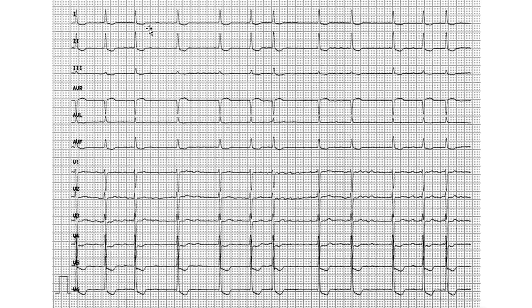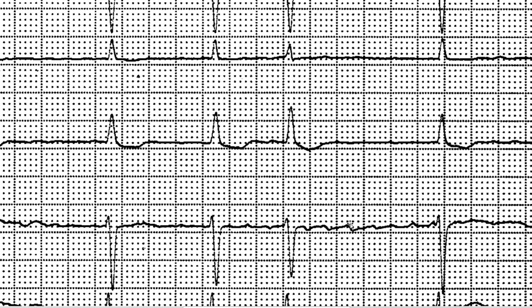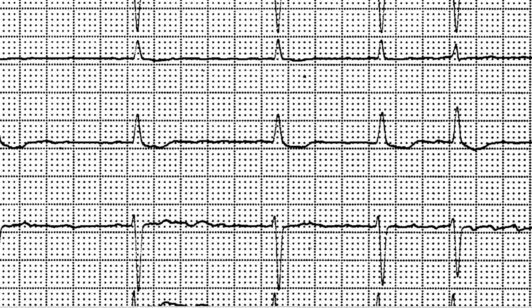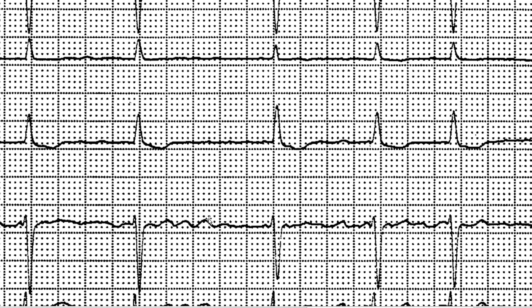And what is going to be? You can check the heart rate. And then afterwards you check here, is it flutter or fibrillation? 1, 2, 3, 4, 5. Let's try another area. Let's see where else. Say over here. Okay, that's not very clear. Oh, here. Okay, that's less clear. Oh god, this isn't easy. Oh, here, that's very clear.